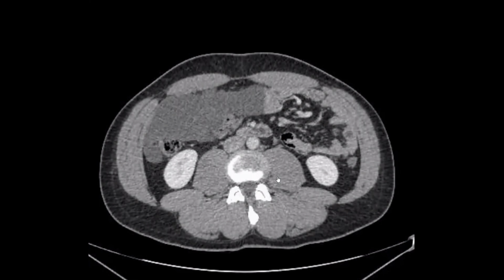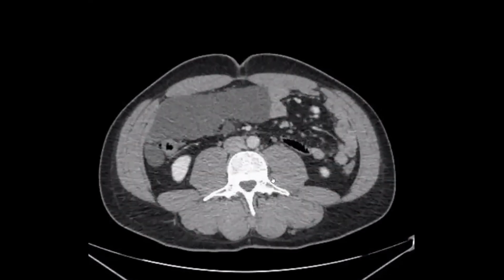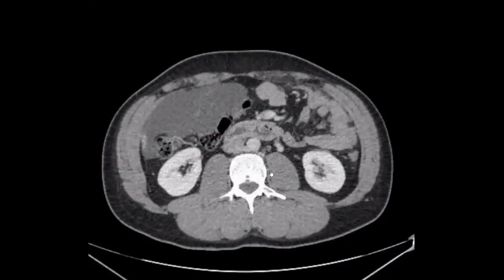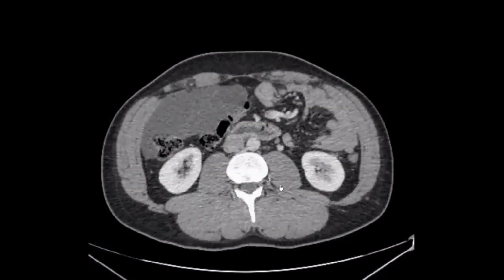Another would be a low density cystic mass. Do you think that it is aggressive or not aggressive? I think it's not aggressive. Agree. So as you said, we have the differential diagnosis for the cystic peritoneal masses. We have three main differential diagnoses. The most common is multicystic peritoneal mesothelioma.